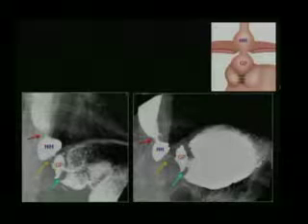This is the same patient. Yes, excellent, very good. Yes. So what is this? Yes, exactly. You did it. This is exactly the illustration.